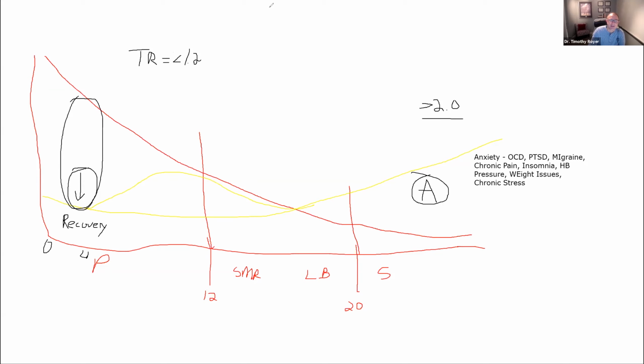It tells me we've got some type of chronic sleep thing going on. When I see this kind of really low valley in those first 4 hertz, the brain isn't recovering correctly. So I'm thinking chronic fatigue. I'm definitely thinking of some type of sleep disorder. I might even be wondering, is this the precursor to some type of memory issue?